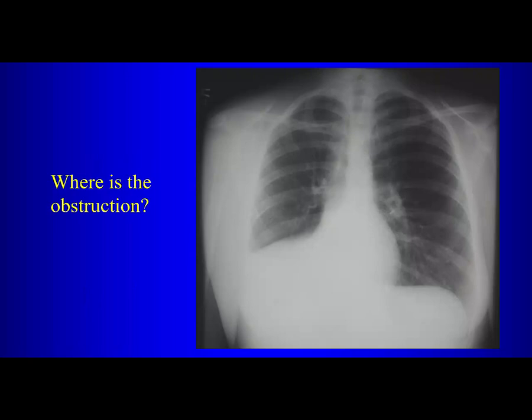So is there volume loss here? Yes. How do we know? There's elevation of the right hemidiaphragm, and also there's been a shift towards the right. Yes, right, the trachea. Is the heart shifted towards the right? Yes. So there's volume loss.